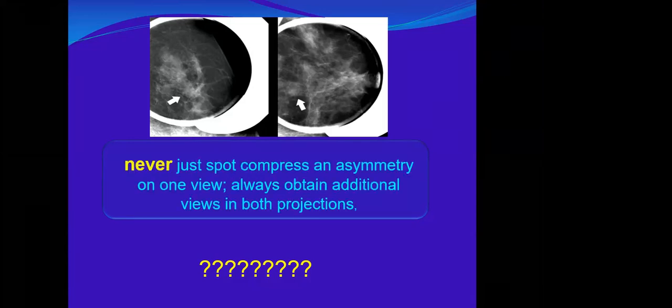In a case of asymmetry, why have I done two projections? Is it necessary or did it just come by chance? Anyone knows? Maybe because I didn't reach the full characterization of the asymmetry by one view.